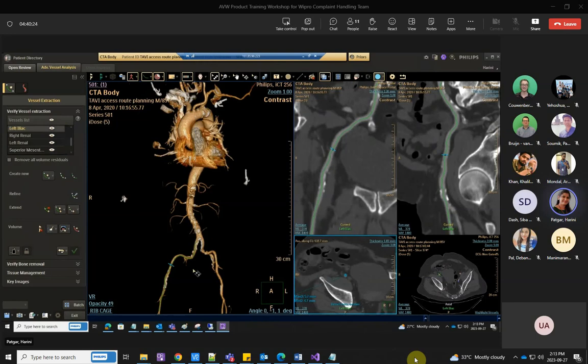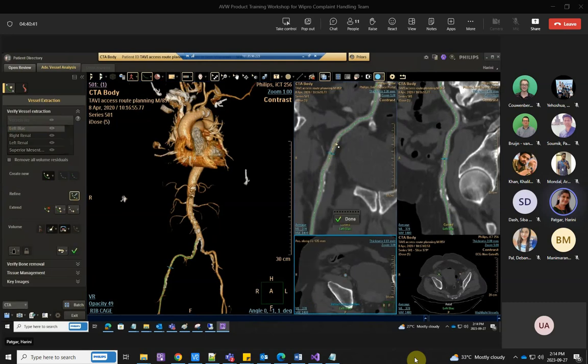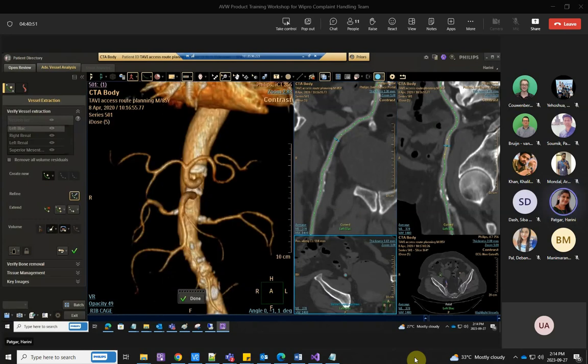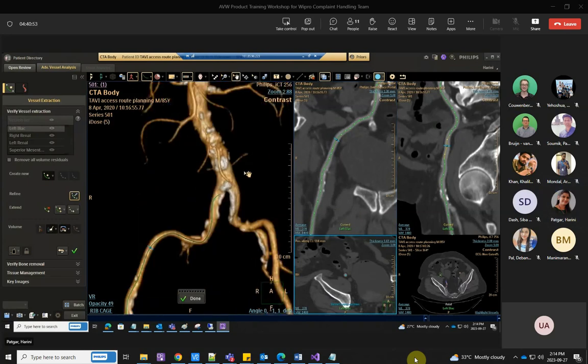So everything is updated. One is creation, and there are two more options to create, like multi points you can place. This is only 2 clicks, this takes multi click. Similar way, refining in the sense you will get the seed points here, you will just try to place it in a proper position. Say, see the curvature, it has come out. Maybe I will zoom and show. Zoom, zoom, pan a little up.